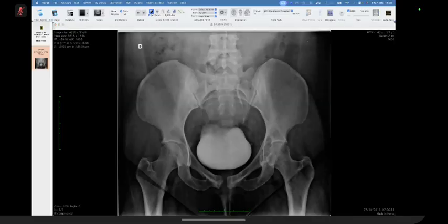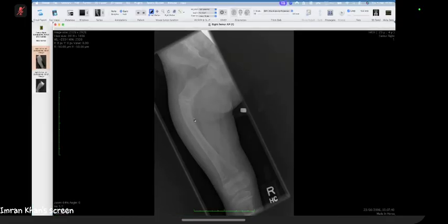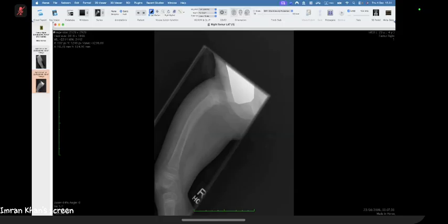Okay, the last case, this one you nailed it. Excellent pass. You knew all the answers. This is pseudoarthrosis, gracile bones with reduced bone density, osteogenesis imperfecta. Pretty much, there aren't many of these striped lines or dense metaphyseal bands related to bisphosphonate therapy. No issues here. You get the highest maximum mark that you can get for this one.